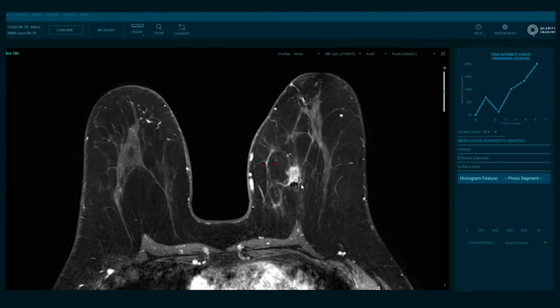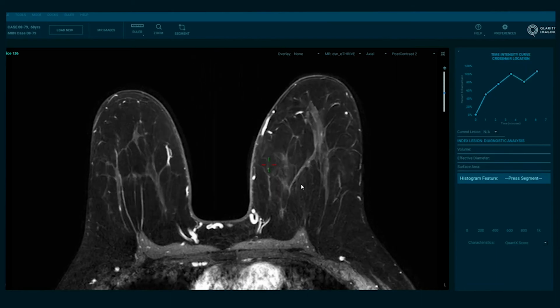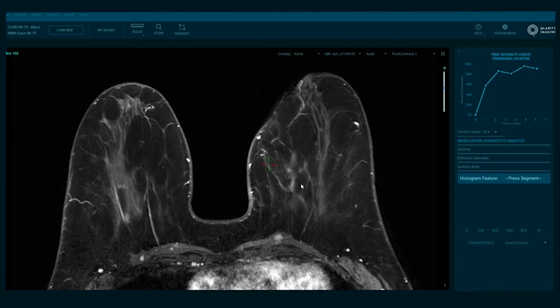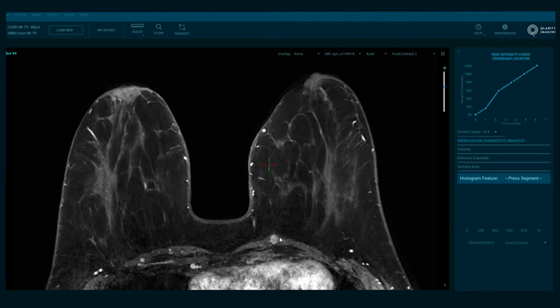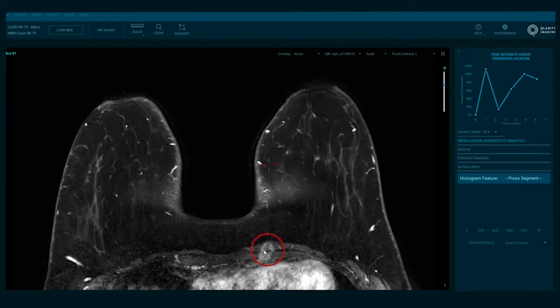And we're going to move forward, looking at the pectoral muscle, and then let's go back up through the image again, through the mass again, looking for any abnormal findings. And here we see enhancement within the pectoral muscle itself, which indicates pectoralis muscle involvement. And I think if we go a little further, here we can see it, we might be able to see another area of enhancement right here. So there's two areas which show significant pectoralis muscle enhancement.